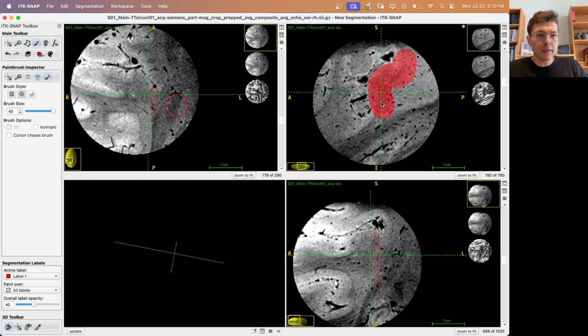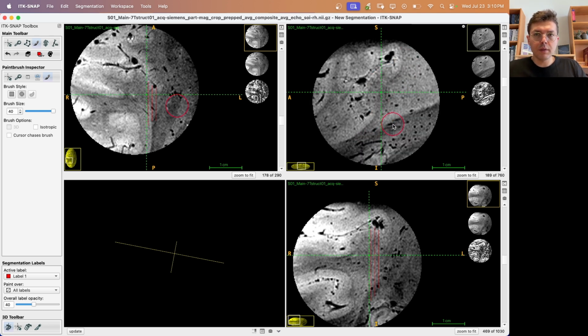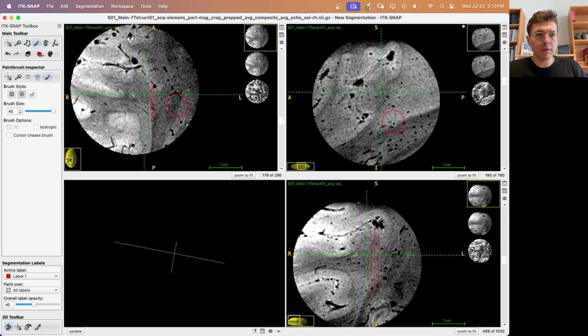It is a little bit like sculpting, doing this work. And you will see that this rough outline will become more and more polished in the future. 2, 3, 4, 5, 6, 7.